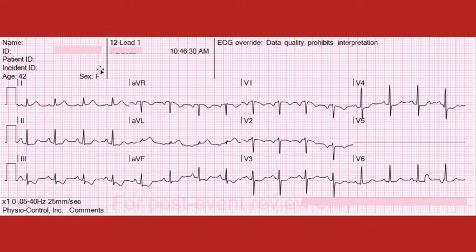So we have some broad-based ST segment depression here. Should we be concerned about this? Well, of course, any ST segment depression merits a further scrutinized investigation. And something we should ask ourselves is, is the ST depression truly broad-based, that is, spread out globally across the ECG, and is it maximal in leads 2 and V5 that would be consistent with subendocardial ischemia?